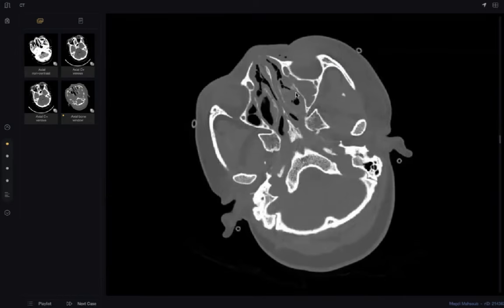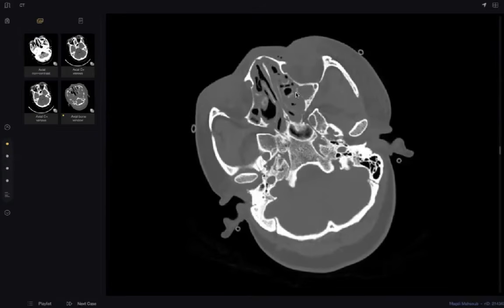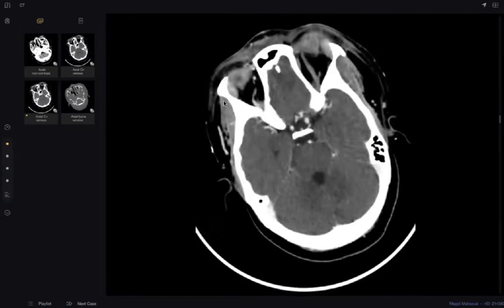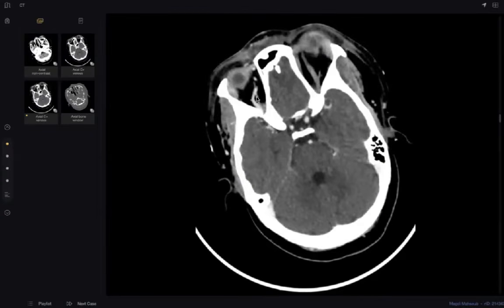So the most common findings, either hyperdensity in CT or bone destruction, or invasion to any extra-sinus extension, are all sure signs of the invasive pattern of fungal sinusitis. Besides that, we have one very sure sign here: this thrombosis. This indicates that we are dealing with a non-benign, very aggressive fungal sinusitis. Is it clear, doctor?